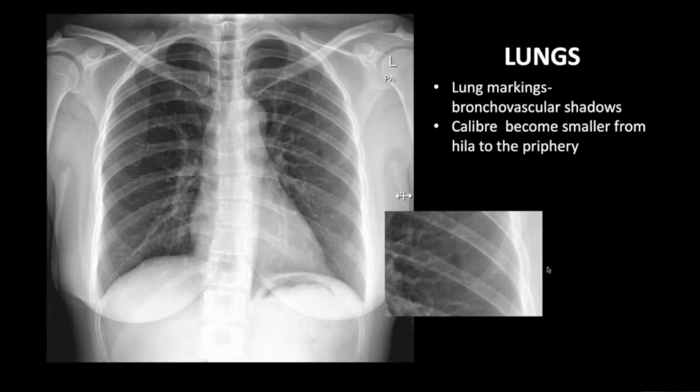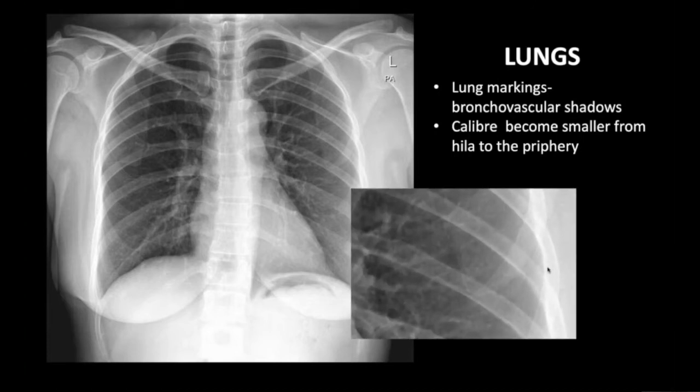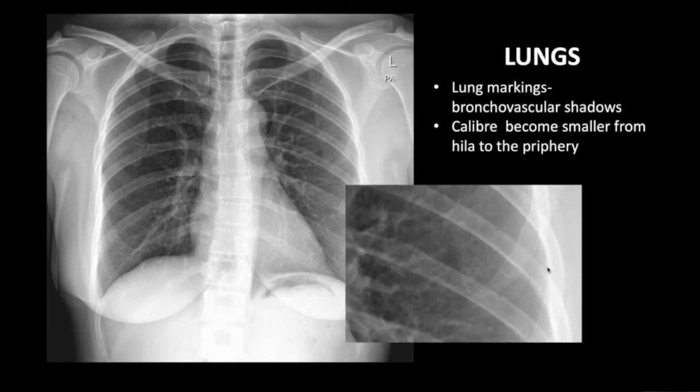Within the lungs of a normal chest radiograph, one can observe lung markings, which are mainly made of vessels. The airways are filled with air, hence their density are generally inseparable from the surrounding lungs. The markings taper in caliber from the hila to the periphery. When there is pathology causing thickening of the surrounding interstitium of the walls of the vessels and airway seen, the term increased bronchovascular markings may be used, given that the outline of the thickened airways are also seen.